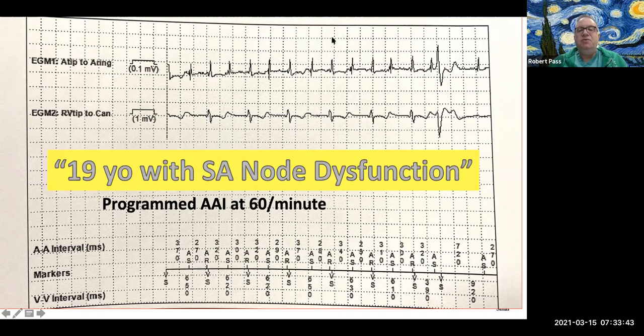So we would presume that this is atrial flutter of some sort, or intra-atrial reentrant tachycardia. But the fact that the patient can't conduct at this rate is concerning, and it suggests that this patient probably should be programmed in some kind of a dual chamber modality.